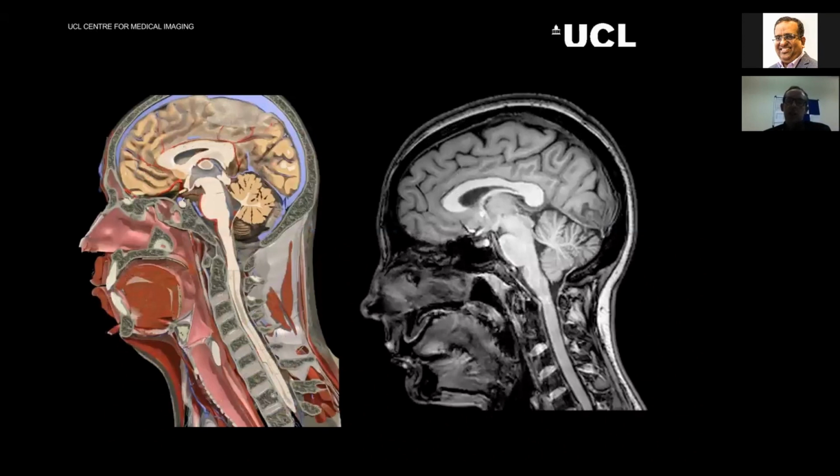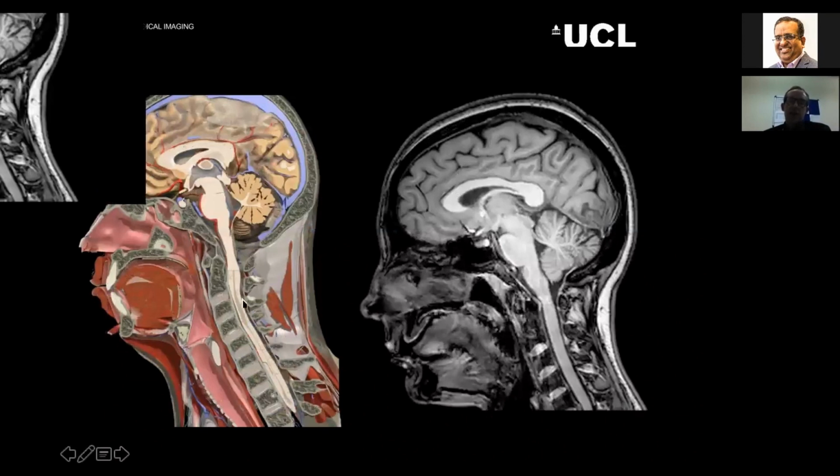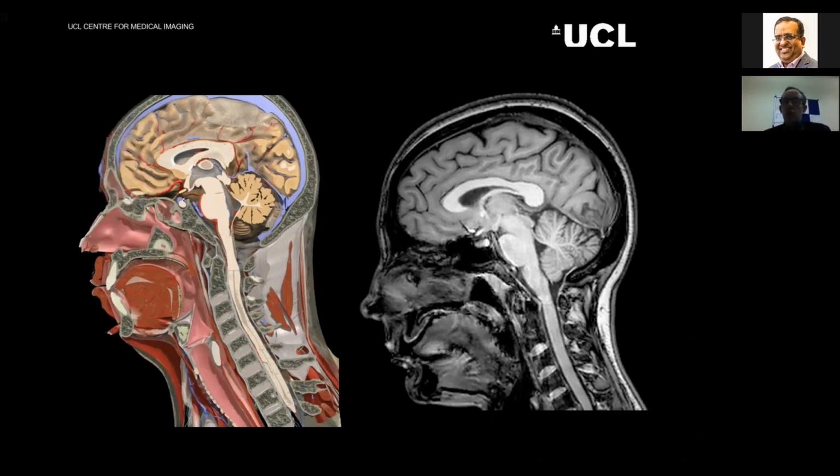And again, looking at a sagittal of the MR, and I've given you the anatomical slice through. This is almost a given to some extent: one of you will get this sequence in the long cases, because it works very nicely, and sagittal MR is a particular favorite.